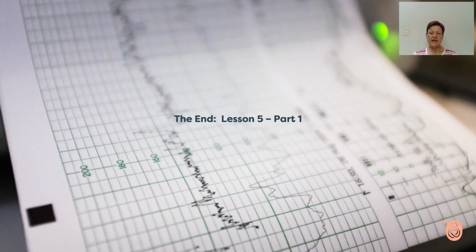And that is then the end of lesson 5. Remember all the things that I taught you about the normal baseline and the normal variability. Again, we're going to use them over and over and over again, especially when we come to the abnormal CTGs, which we will do in lesson 6.